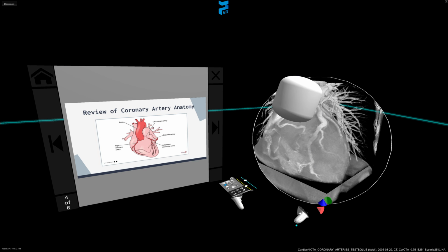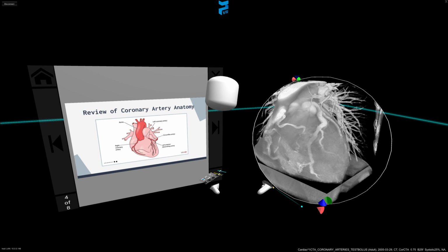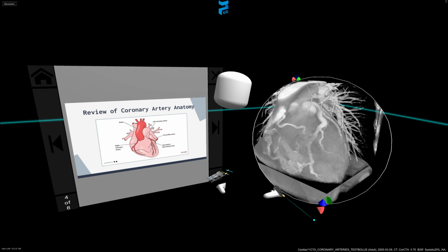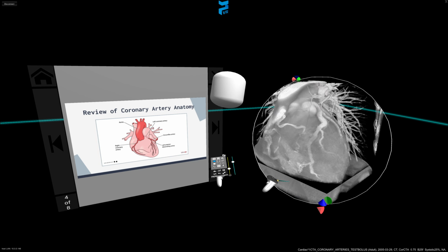Now, if we take a look at the arteries on this image, which is not taken from the patient in our case, they all look rather healthy. You can look for any collateral vessels that have developed, indicating that there is obstruction of flow and the heart is compensating. You can also look for evidence of left ventricular hypertrophy or other signs of muscle weakness on this imaging. And if we look, I don't see any large, obvious points of narrowing in these arteries.